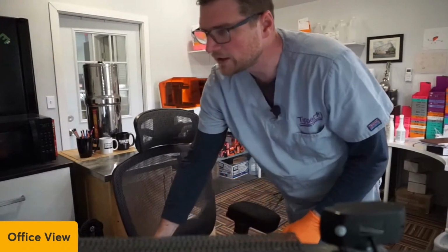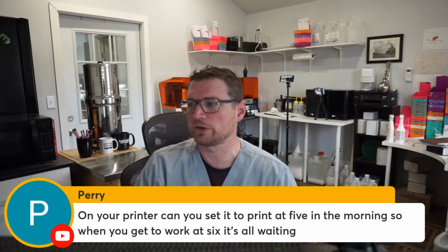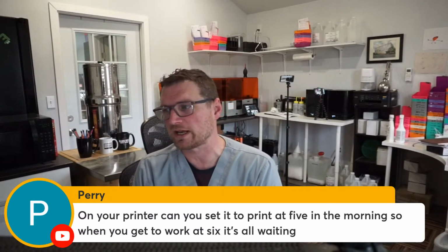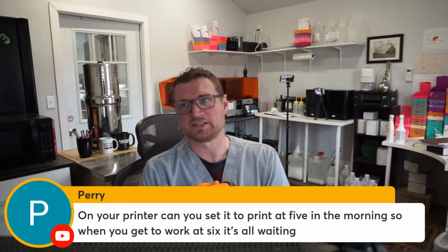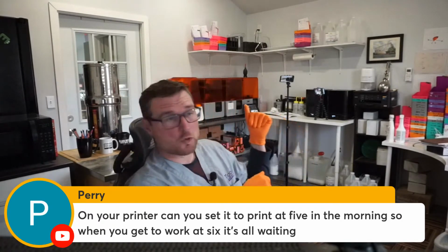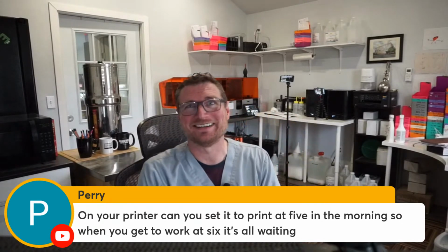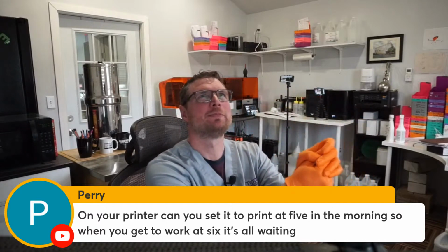On your printer, can you set it to print at 5 in the morning? Oh, good question. On your printer, could you set it to print at 5 in the morning so when you get to work at 6, it's all waiting? Yeah, I think so. I haven't tried it yet, but the Form 3 actually will do that. I know you can remote print it, but scheduling, that's a good question.